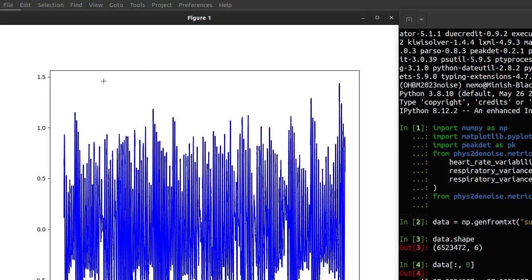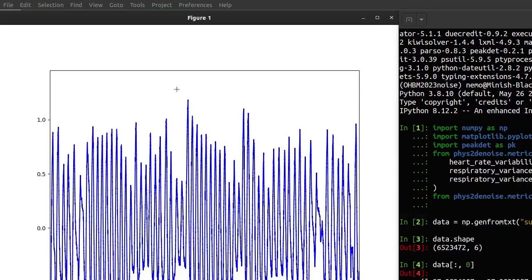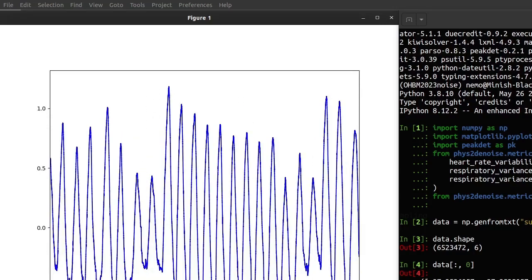Here this is our data. And if you look into our data, it is a respiratory data. You can see that because of the time between the different peaks. So for instance, here we go from second 200 to second 210, and you see more or less 3 respirations, which is more or less correct. It's more or less like 3 seconds per peak. It's maybe a bit fast as a respiration in this case, but it's not that weird.